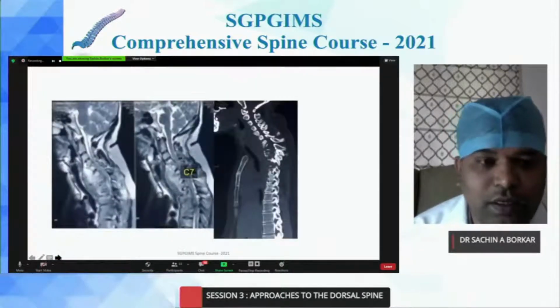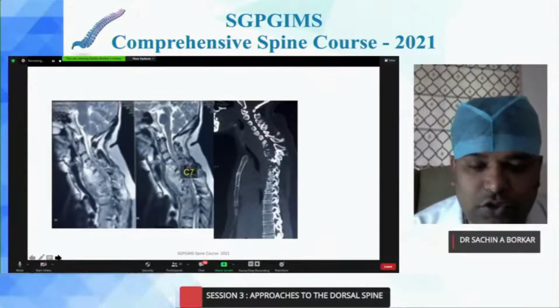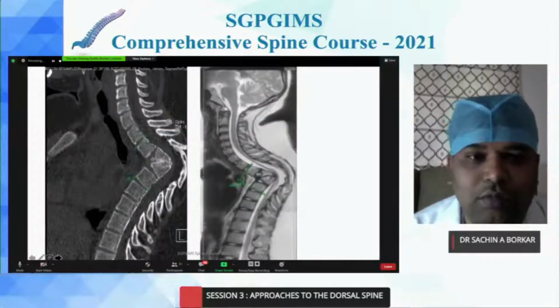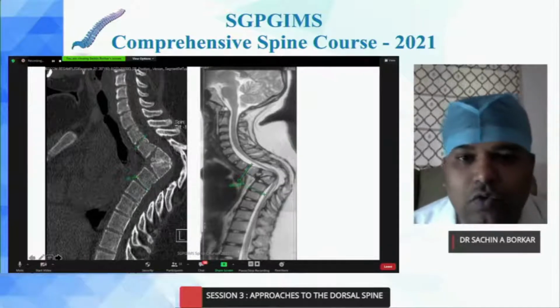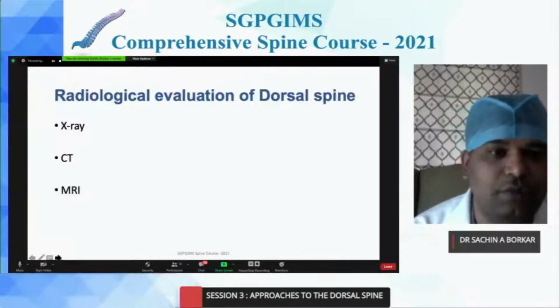Also, something like this, tuberculosis of the spine involving the cervicothoracic junction, a wet lesion, with a prevertebral abscess causing compression, is different from what we see in a post-TB kyphosis like this, a rigid, almost 100-degree kyphosis with the cord stretched like a rubber band over the kyphosis. So all these cases have to be dealt with differently compared to a standard one-size-fits-all approach.